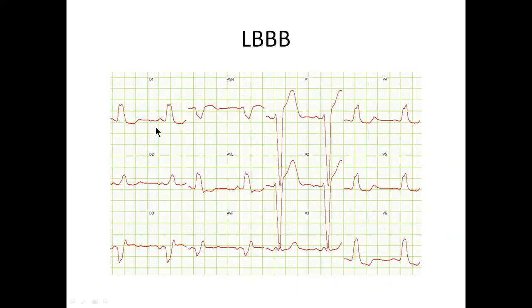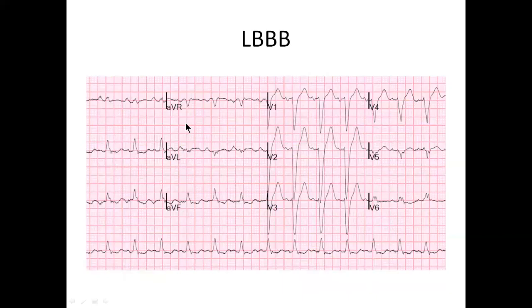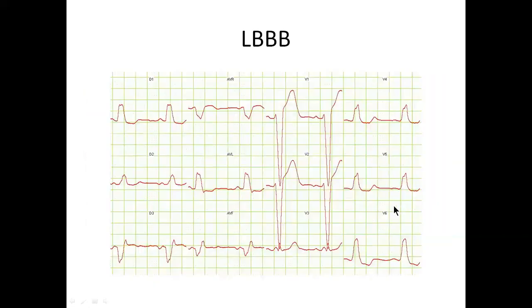See that? Here is another example, an ECG with the QRS, which is really broad. But the reason I put that here is sometimes it's not as tall as you would like it to be. But this is the classic picture you have to remember.